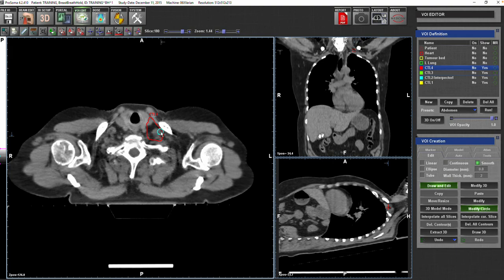When you go to the space between the clavicle and the transverse process of the spine, or later on where the first rib comes in here, there will be a space where you don't know where to go. There is a muscle called the posterior scalene muscle, and sometimes you can just feel the space and end up with something like that. And I would do it.